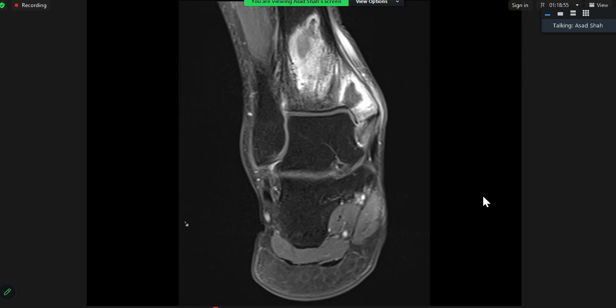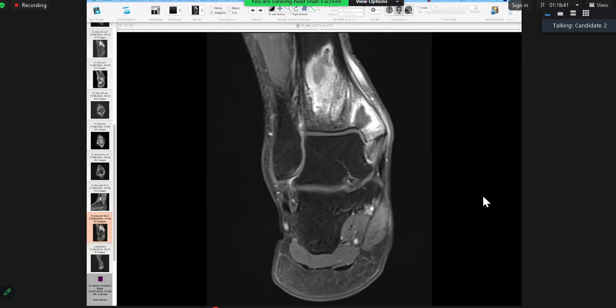You think metastases will be on the top or primary bone tumor will be on the top? Primary bone tumor, giant cell tumor. Okay. Why do you say giant cell? As the epiphyses in this case, physes are closed and it is in the subarticular distribution. Okay, that's good. All right. So what will be the next step then?